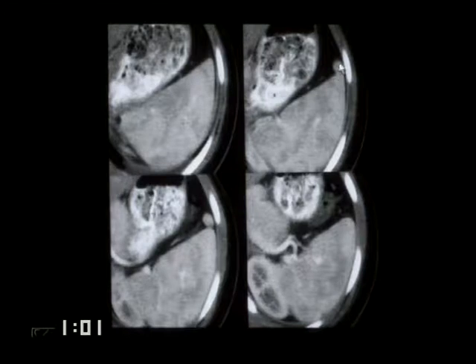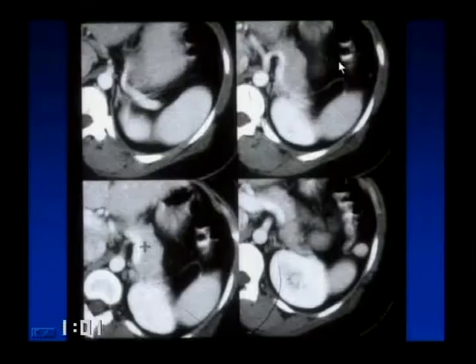To be an actual accessory spleen, it has to be a separate entity, usually with its own separate blood supply. This would be an example of an accessory spleen. If you look at all the images, you can trace this little wandering vessel and see the separate supply to the accessory spleen. I think it's important to recognize normal variations, particularly simple things like clefts in the spleen.